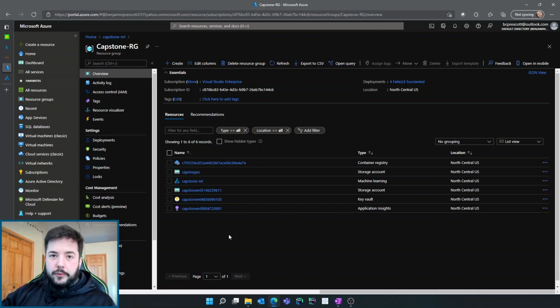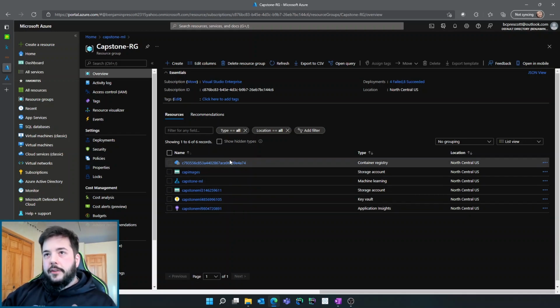What you see here is my personal tenant. Everything was ported over from a tenant that we shared during the project. Everything that you see here is the exact same as what we did. The only difference is you may see small changes in accuracy or loss percentages of the models. The real reason for that is the networks are stochastic in nature, so they're not always going to be the same. The results will not always be exactly the same. So you won't see it exactly as it was when we published it, but ultimately everything else is exactly the same.